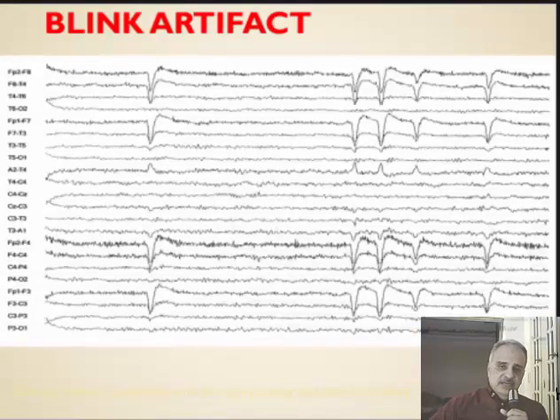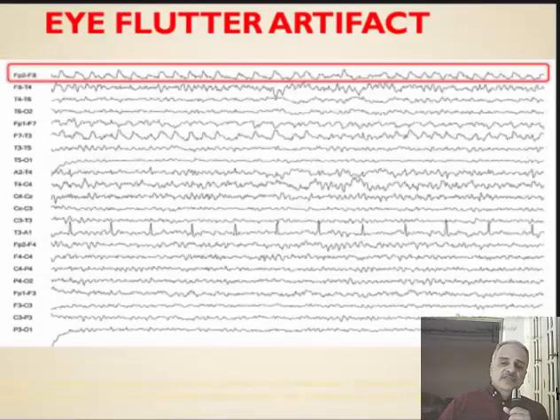This is an eye blink artifact. It's evident anteriorly in the frontopolar mainly, and as we look to the channels posterior to them, these dipping surface positive waves are fading backward and will never appear in the posterior electrodes like the occipital, parietal, and posterior temporal ones.